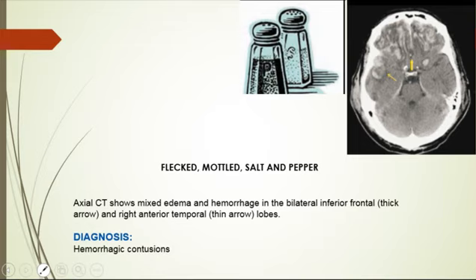Petechial hemorrhage reflects traumatic shearing of the small vessels and may be seen at the gray-white junction, deep gray matter, brainstem, and periventricular regions. On the CT, the combination of hypodense edema and hyperdense hemorrhage produces what's called the salt and pepper appearance. The edema is hypo, the hemorrhage is hyper, mixed together, giving the salt and pepper appearance. Small, simple contusions may normalize on follow-up imaging, whereas large and severe contusions progress to encephalomalacia. Late complications include attention deficit, emotional abnormalities, and memory deficits. Okay? Good.